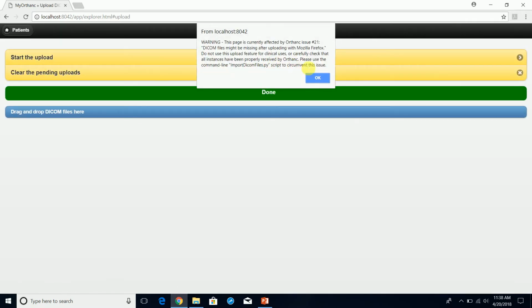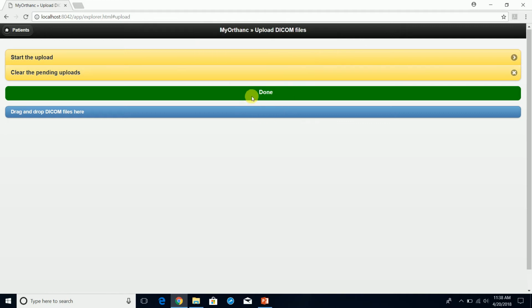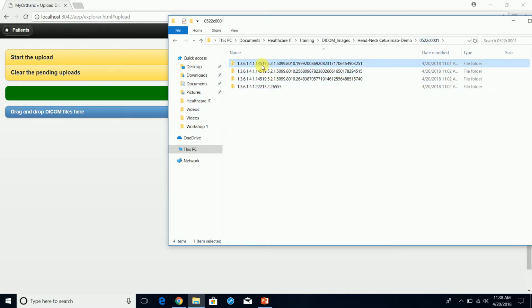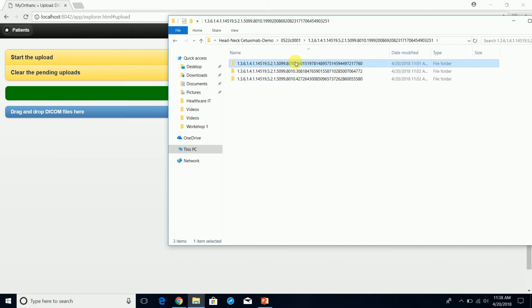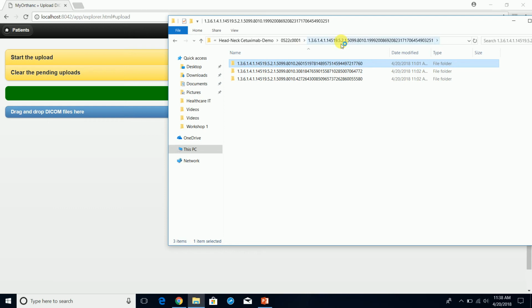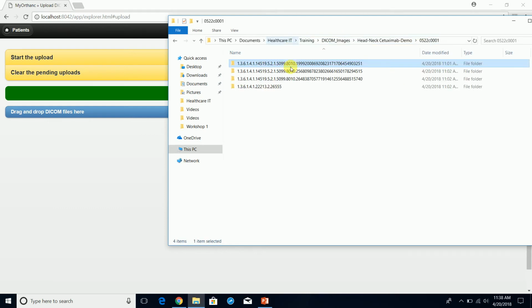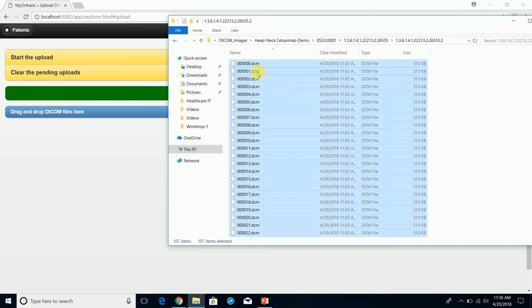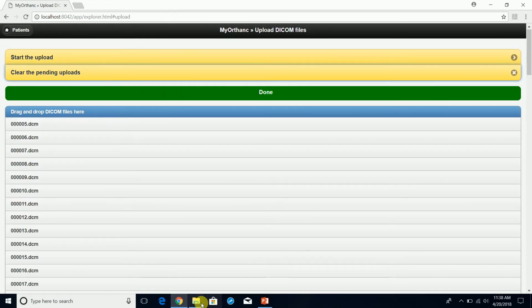Deleted it anyway. So let's go back and upload the study again.